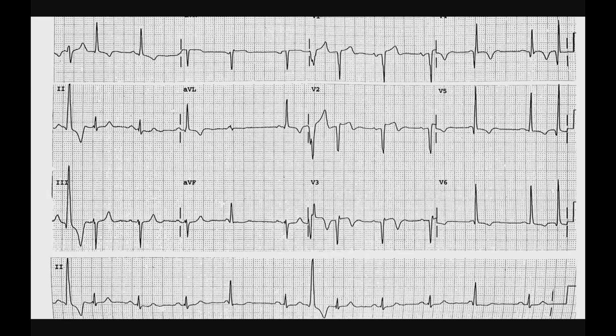So this is an ECG which is showing a few VPCs along with the normal QRS complexes. It's a sinus rhythm ECG with a rate of around 70 to 75.